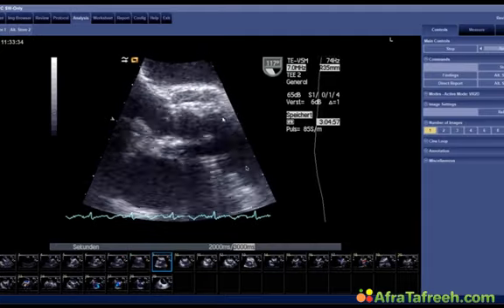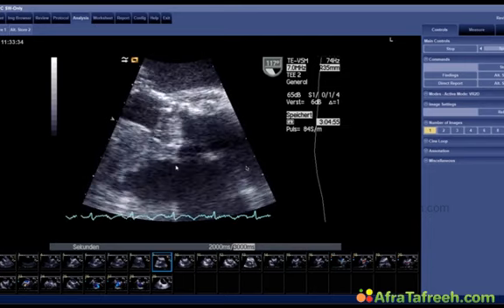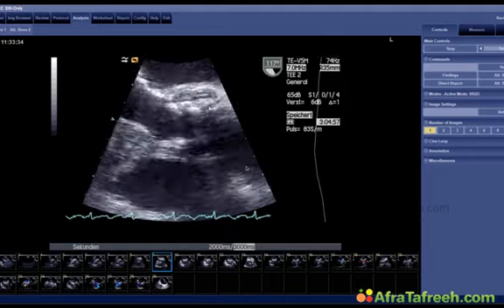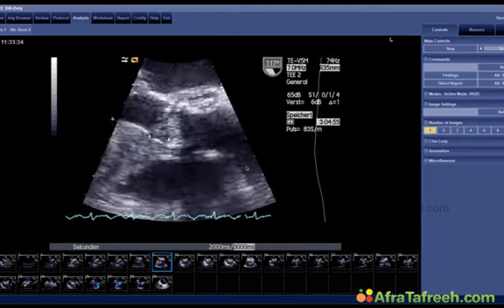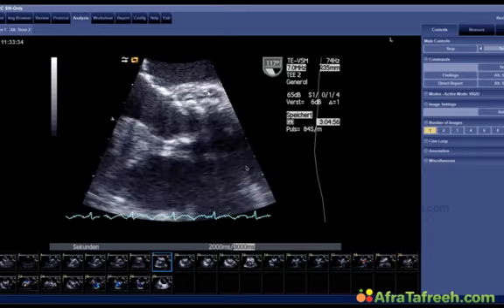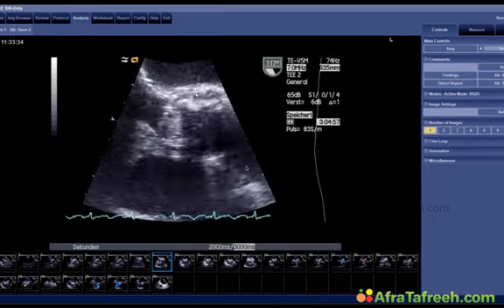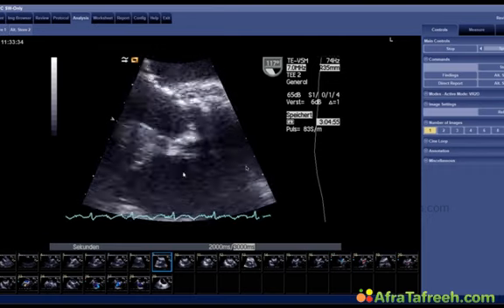Now, this is the aortic valve. This is the bioprosthesis. And even though this is maybe not the best of all TE qualities, we've seen better studies, you can still appreciate that there is a lot more information. First of all, yes, the vegetation is here right on the aortic valve, on the cusp of the valve. But then you also see that there's this echo-free space, which does show a few echoes inside, and then there's motion of this part of the aorta here.